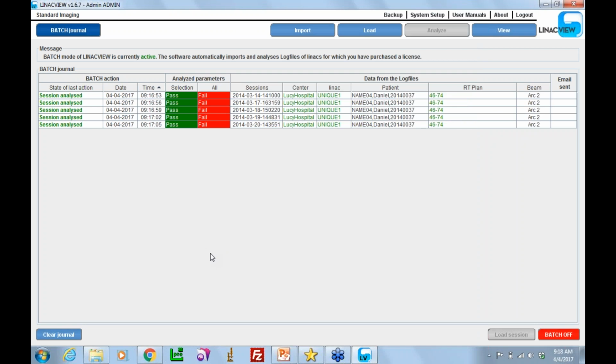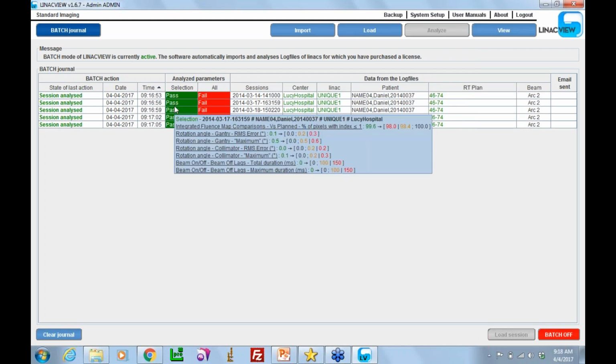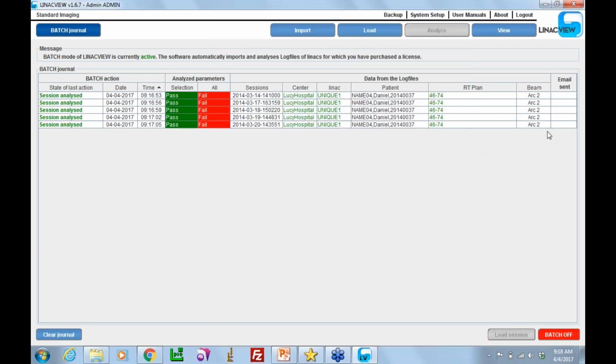Okay, so we just did that calculation. If I had some sort of warning or error on the clinical side, I would have had an email sent to me. Then that's all depending on how you set your thresholds. I'm using a template that doesn't find anything over there. So it shows you that you can customize that.